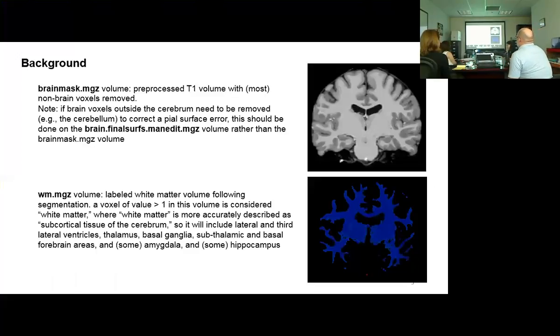Jason, did you say that it normalizes both? It tries to make the white the same intensity and the gray the same intensity? I believe it tries to normalize them both.